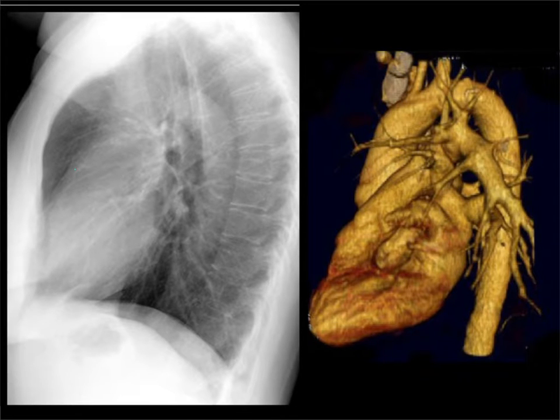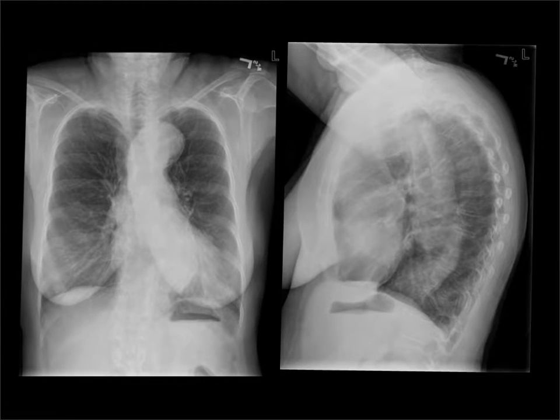So the ascending aorta is going to come out of the heart here before it sweeps round. So this is where we will see enlargement of the ascending aorta. This is an elderly lady who has a huge ascending and descending thoracic aortic aneurysm. This is breast shadow here, but this is aorta here. So it sweeps out and over, clearly enlarged, and here it is completely filling up the retrosternal space on the lateral radiograph, and then there's this massive, tortuous aorta on the way down.